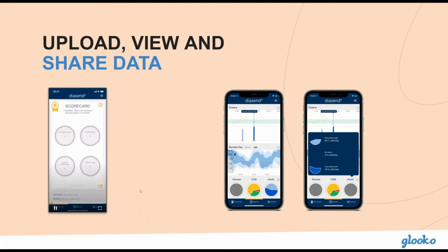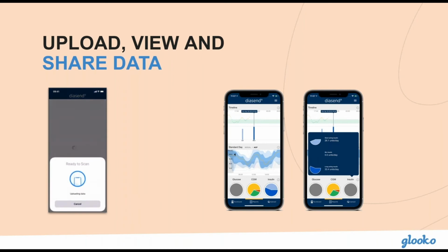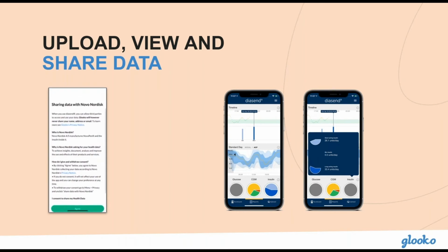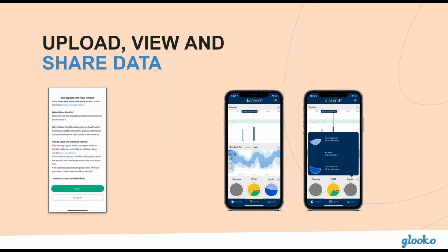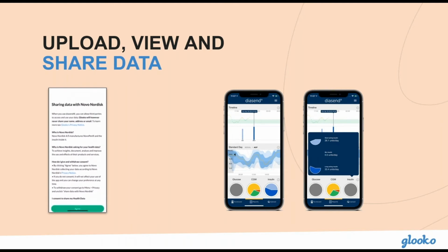So here you'll see that the patient would then navigate to the Upload tab at the bottom of the screen, select NFC, Start Upload, and place their pen to their smartphone. Once the upload is complete, they would select the type of insulin that is being used within their pen and click Done. After the upload is complete, they're then able to share data with our partner Novo Nordisk for the purpose of product development and research.